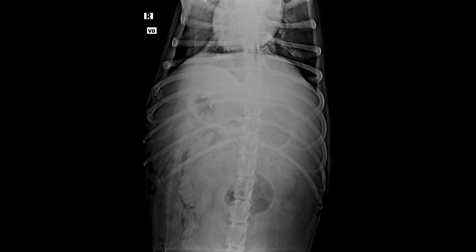This 10-and-a-half-year-old male entire Labrador Retriever presents for vehicular trauma about 45 minutes prior to presentation. A witness identified that his back end was struck by a car. Let's take a look at the radiographs.